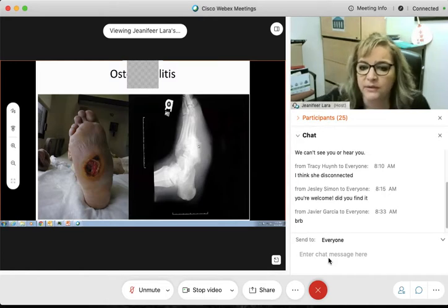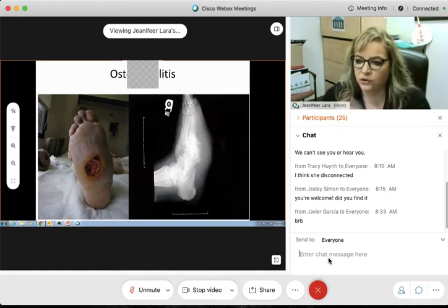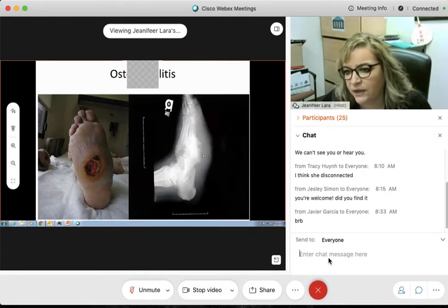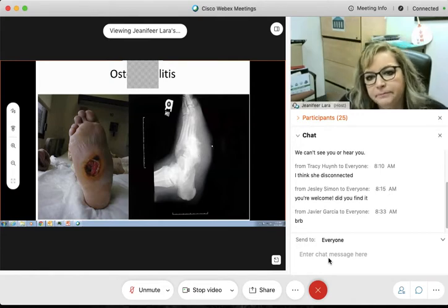Yes, so we're absorbing x-rays, so it takes on the same appearance as the bone itself. So it's either absorbing, whether this is going to be more fluid in the area that absorbs those x-rays equally like it would the foot, or you start to see some calcification. Okay? Any questions?